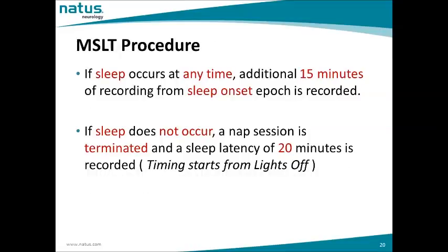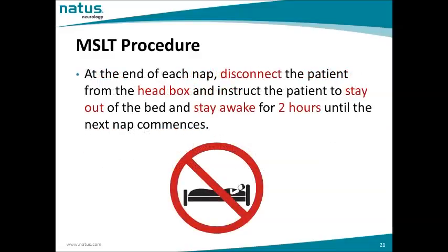So the MSLT procedure: if sleep occurs at any time, an additional 15 minutes of recording from sleep onset epoch is recorded. If sleep does not occur, the nap session is terminated and a sleep latency of 20 minutes is recorded. And this timing starts from lights off. At the end of each nap, disconnect the patient from the headbox and instruct the patient to stay out of the bed and stay awake for 2 hours until the next nap commences.